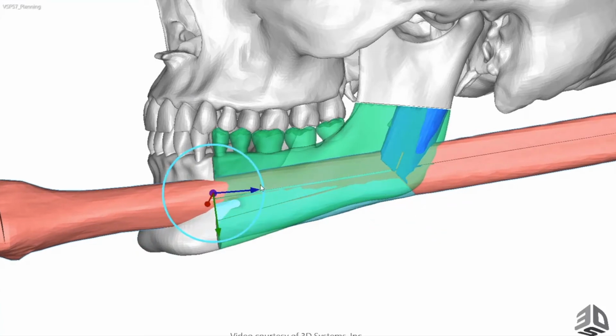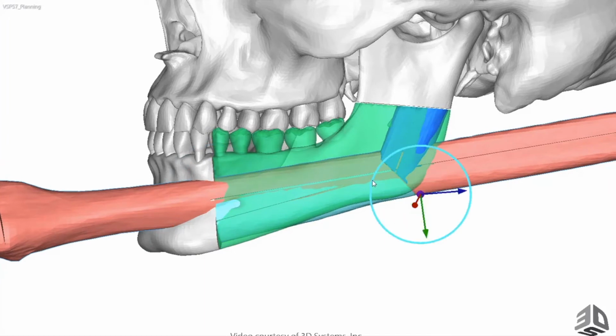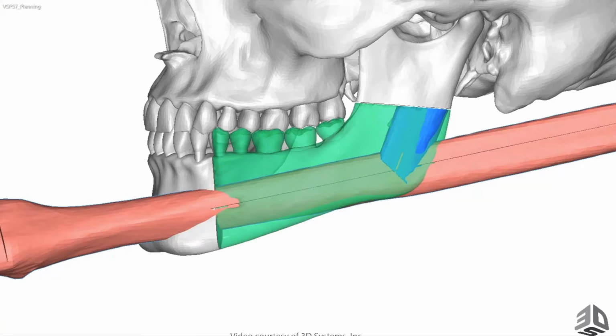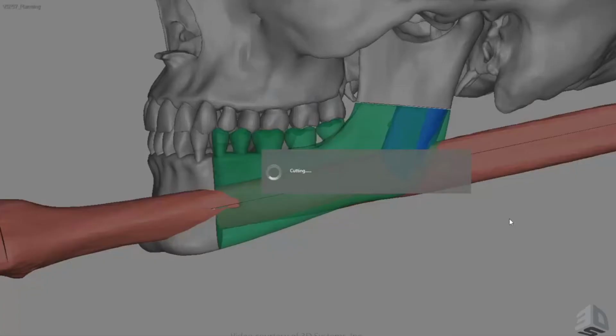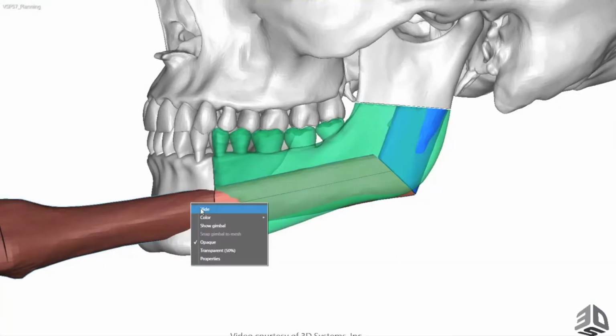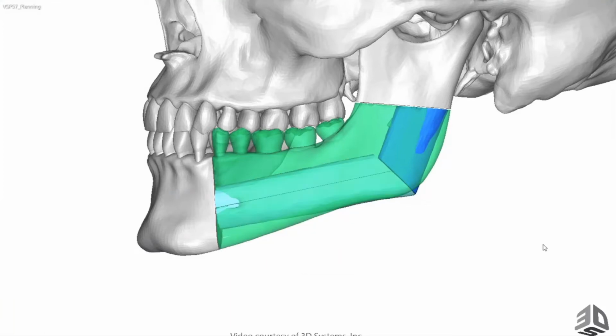We talk about form and function. Actually, for the mandible to just be lifted up a little bit, it doesn't cause too much of a disfigurement if the lower border is raised a little bit. But what it does mean is that you can have a much better restorative volume in terms of your dental rehabilitation. That would give us a segment something like right there, which is definitely much more parallel with that occlusal surface. Yeah, okay, perfect. So I'm happy to proceed with the plan.